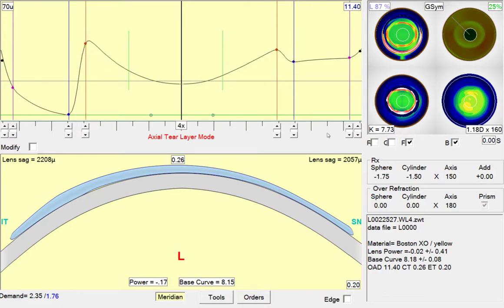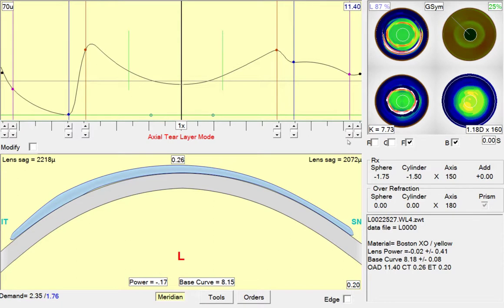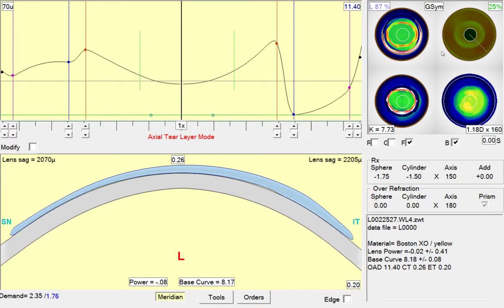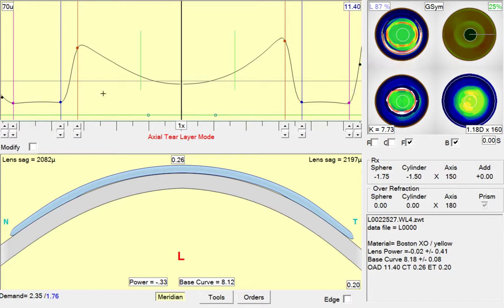787, and 1800. The lens does look a little bit weird, but if this is what works, then I think most of us will take the good result over a nicely laid out simulated fluorescein.